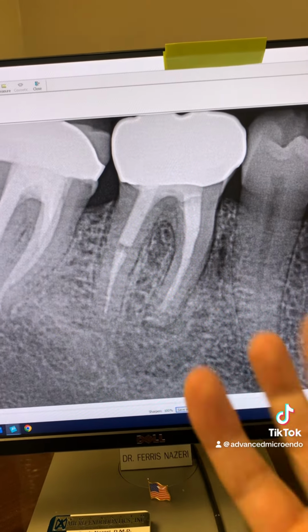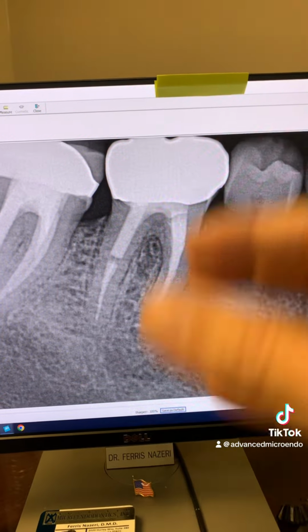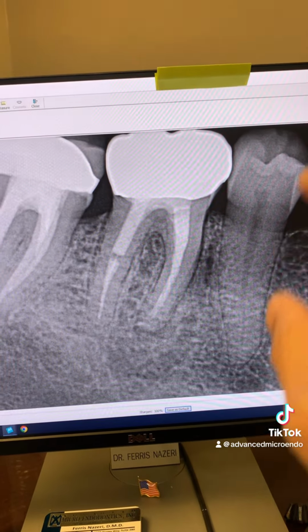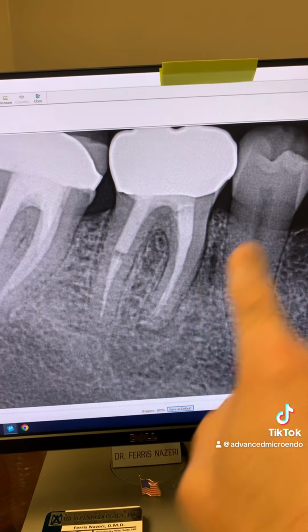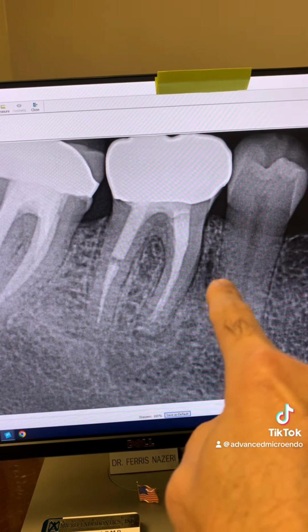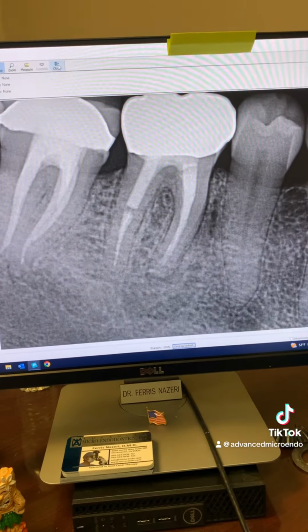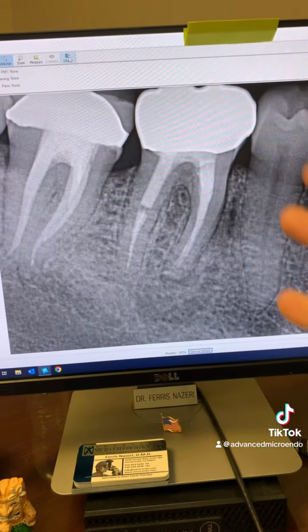But all of that combined, all the information that you gather: multiple angulation PAs, the location of the sinus tract, the fact that there are no periapical lucencies, where the lucency is so mesially corresponding to the sinus. All of that, you need to put all of that together. What would have happened if I had missed all of this?